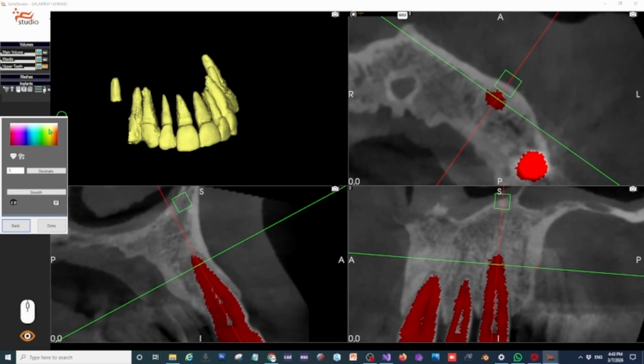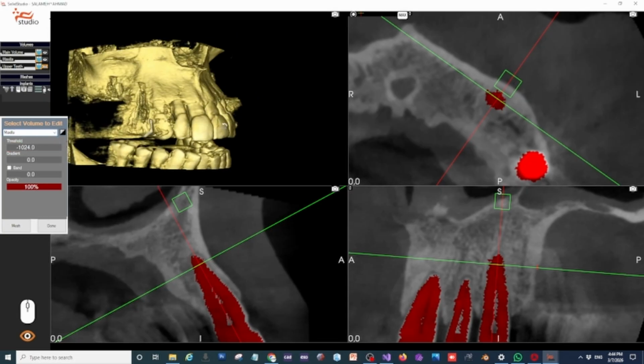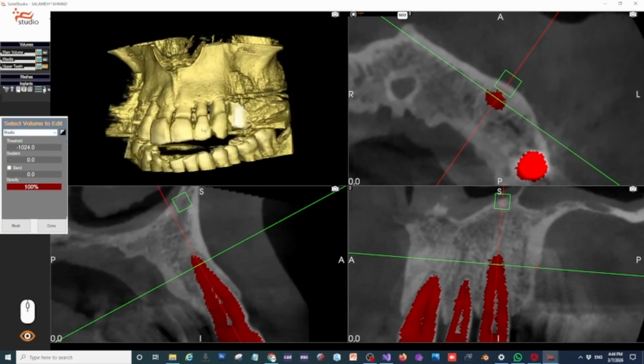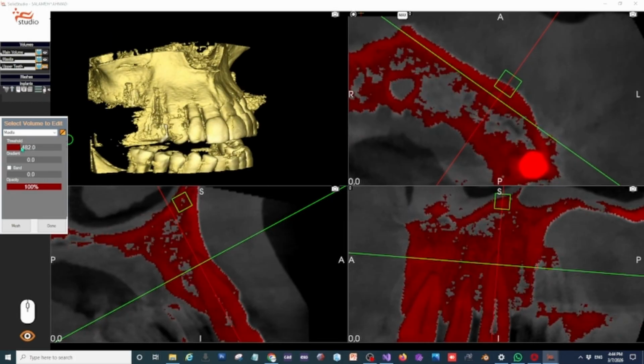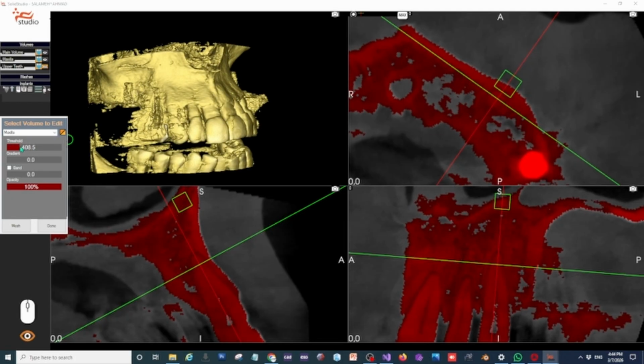the surrounding bone. Select maxilla from the volume list. You will notice the segmented teeth disappear, replaced by the unsegmented maxillary volume, allowing us to begin the next phase of the process. We'll begin by setting the appropriate threshold to ensure the bone is clearly defined.